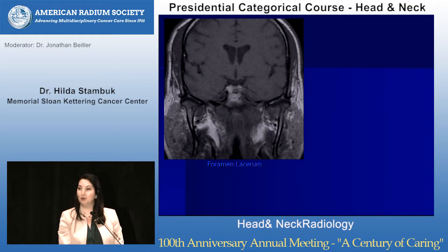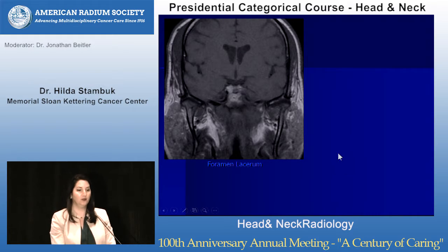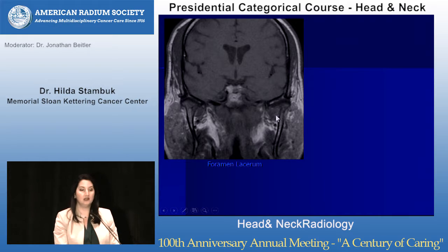Well, there are other things in bone that's north of the nasopharynx. If you look on this coronal pre-contrast T1 weighted image, I can already see there's a problem. Look at the fatty medullary space, the marrow of the skull base, and if you look centrally, you can see that this fatty marrow is replaced. This is Meckel's cave. Even without contrast, I can see the opposite side's already in trouble. It's soft tissue filled, as is the bone bilaterally.